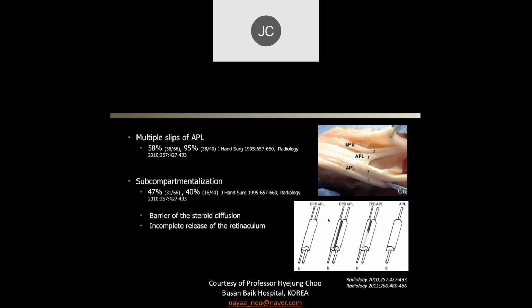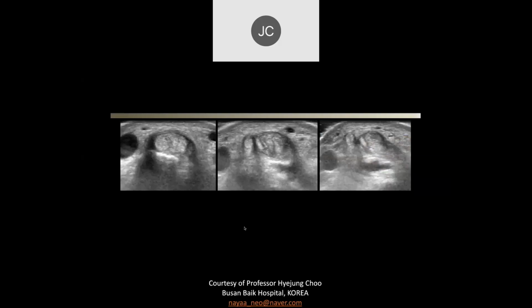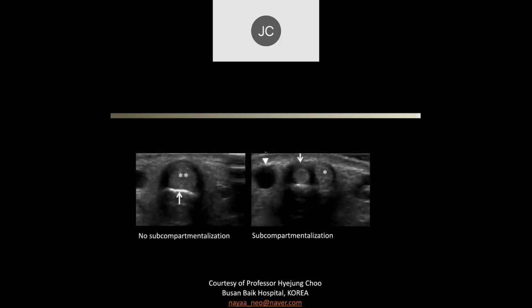It means that if you try to inject steroids to treat it, you may have to be careful. You may have to put in contrast to make sure that you get into the right compartment of the tendon that may be involved. And if you try to do a release, you have to be careful to make sure that the anatomy doesn't cause difficulty with releases. Here's an ultrasound showing the tendon, which we saw was enlarged on the MR.